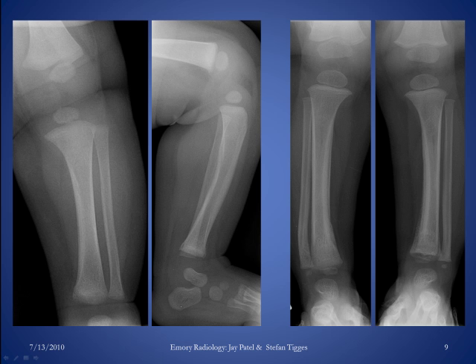Here are 4 radiographs of the bones of the lower extremities in a child, also demonstrating similar findings as on the previous image. So on this radiograph, we're seeing corner fractures anteriorly and posteriorly in the distal tibia. Here we are seeing some periosteal reaction adjacent to the tibia. So this is normal cortex here, and adjacent to that is some periosteal reaction, which is concerning for trauma or non-accidental trauma. Here is also some periosteal reaction adjacent to the fibula.